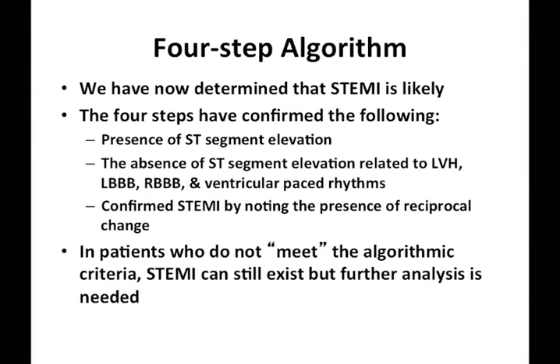So, using this four-step algorithm, we have now determined that STEMI is likely if we have yes answers to all four questions. The 4 steps have confirmed the following. With question 1, the presence of ST elevation. With question 2, the absence of ST segment elevation related to common patterns that cause elevation, not related to infarction, including LVH, left and right bundle branch block, and ventricular pace patterns. With question 4, we confirm the presence of STEMI by noting the presence of reciprocal ST depression or reciprocal change.